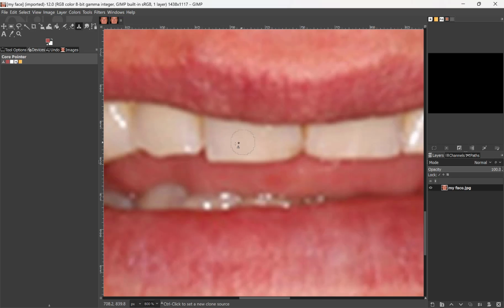One of them would be to use this clone stamp tool. So when I hold down Control, you can see it selects wherever I click on, and now that becomes a paintbrush. Okay, so I could add some incisal length, right? I'll periodically grab from a different spot just so that I keep a nice blend to all this. And then I'm going to grab this incisal edge and transport that down here. And what I'll show you is just how I'll blend all of those together.